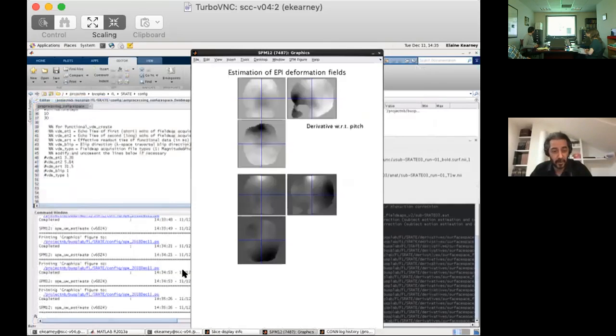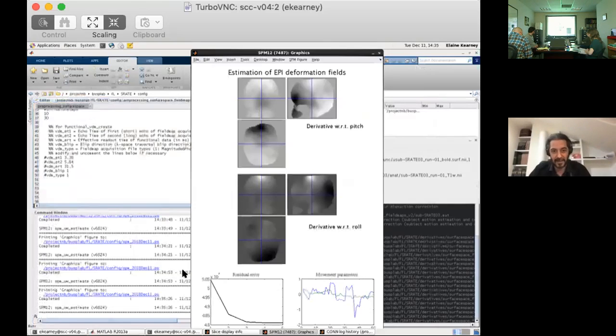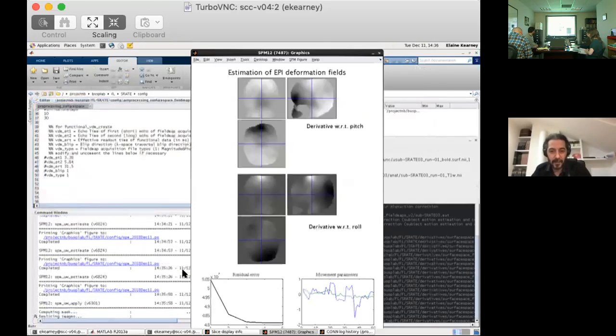And I think we have that information for these files in the DICOMs, the J plus or J minus information. It's only that we are not 100% certain whether that means a positive number in terms of SPM conventions or not. In any case, trying it out never hurts. We should see a difference in the results, and one of them should be clearly better than the other.